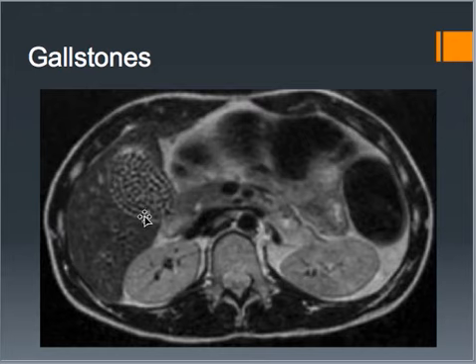The patient has gallstones. So here's the gallbladder right here, and all of these little white dots in there are gallstones. Those are actually really hard to see on x-ray without any form of contrast. So with MRI, it's easier to depict the gallstones.